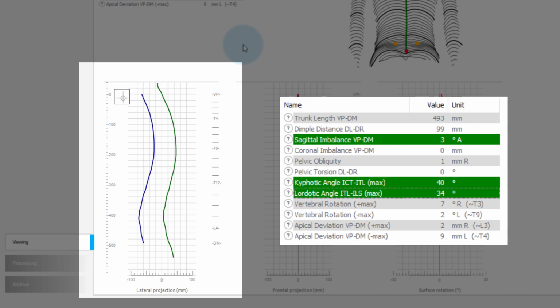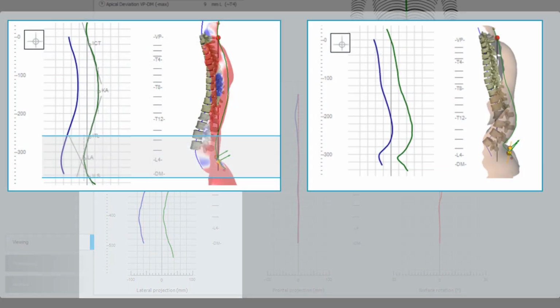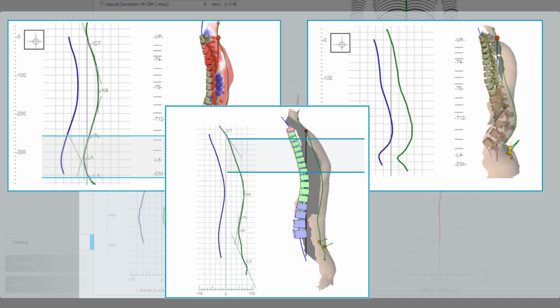In addition to the absolute values of the parameters, subjective impressions can also be helpful in the final findings. Over what length does the lordosis extend? How harmonious does the kyphotic shape look? Can you detect longer vertical alignments?